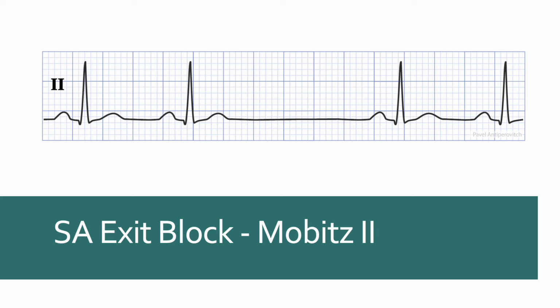The first thing I do when I see a pause in the sinus rate like this, I caliper out the P2P interval, and I move it over 1. This is where your calipers become very helpful, because you can move over 1 and see where the next sinus P wave would have been, and it's not there. And then I move over another cycle, and I find that the following P wave comes back exactly on schedule.